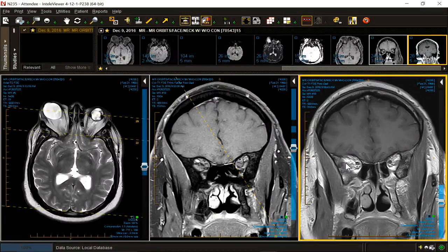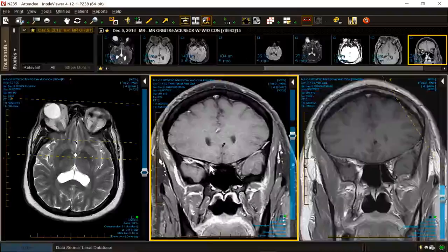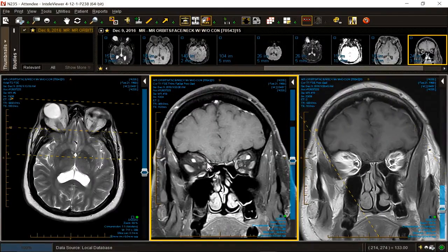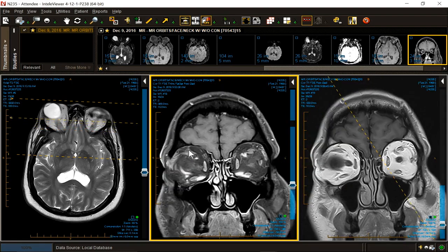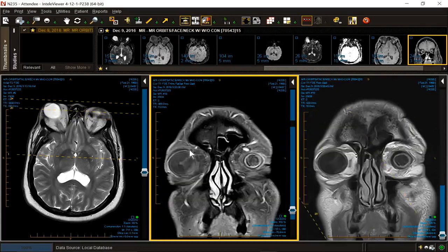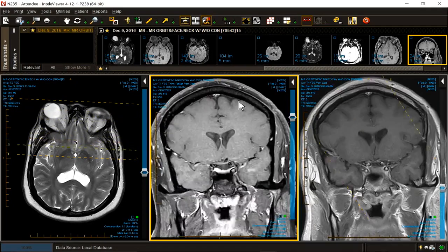It's a man, so that takes you a little bit away from Graves' disease or thyroid ophthalmopathy. There sure is a lot of proptosis, and there sure is a lot of fat. Now, what other conditions can enlarge the optic nerves? What other conditions can enlarge the muscles? Give me a few. Acromegaly, right? So your plain film findings for acromegaly: giant sinuses, big, thick calvarium.